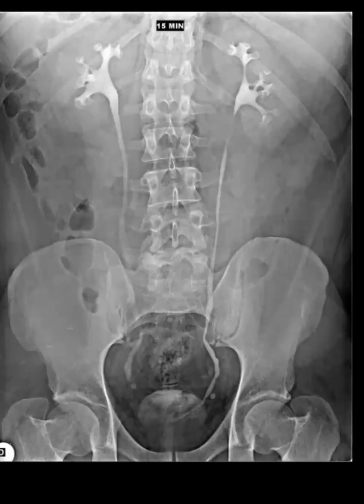Do you think an X-ray abdomen pelvis is usually used for radio-opaque stones? You know that all stones are radio-opaque except the xanthine and uric acid stones. I think it is not a simple X-ray, because it is showing IVU. Yes, it is IVU. You should tell the full name, because some candidates are just beginners.